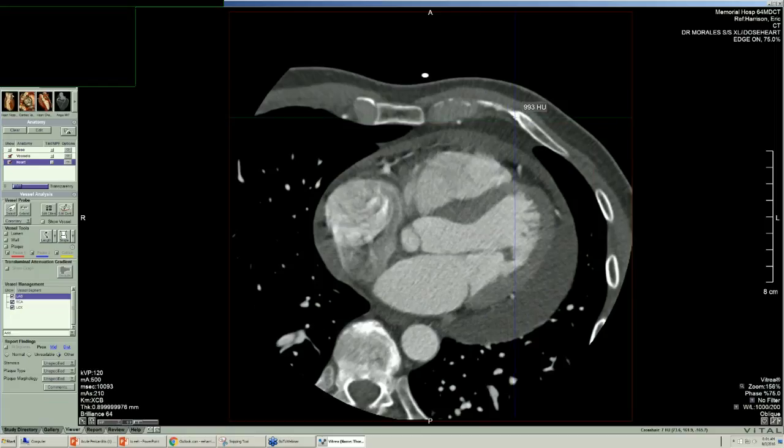You can see bone gets up to 1,000. There's 964 on bone. You can go over to air. Air goes up to -1,000. There's -907. And so what's neutral is water. It's been declared neutral, and so here's -16, here's +16. So revolving around the density of water.